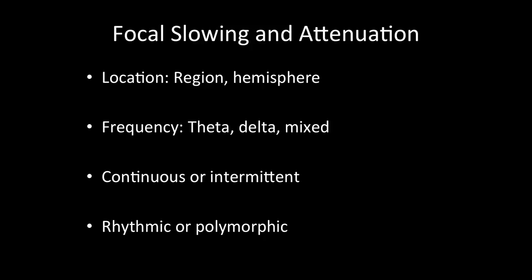To review, it is important to remember the location, the predominant frequency, whether or not it was continuous or intermittent, and whether or not it was rhythmic or polymorphic. This is meant to be an introduction to focal abnormalities, and you will see that this video showed just the tip of the iceberg of focal abnormalities on EEG.